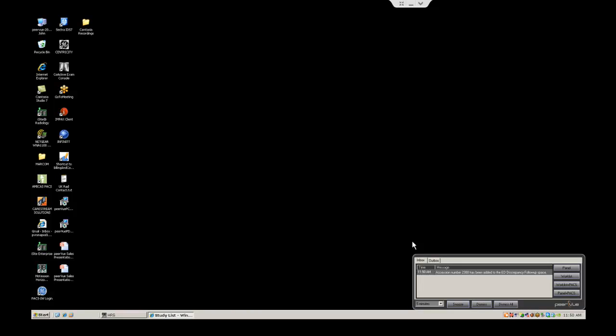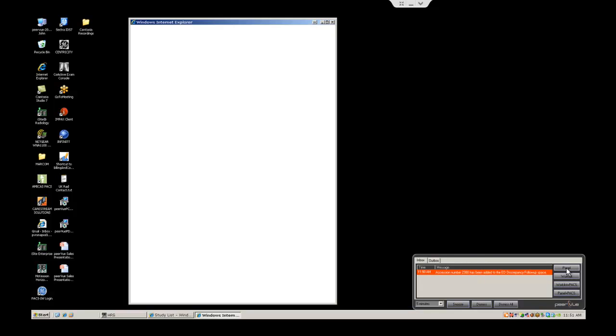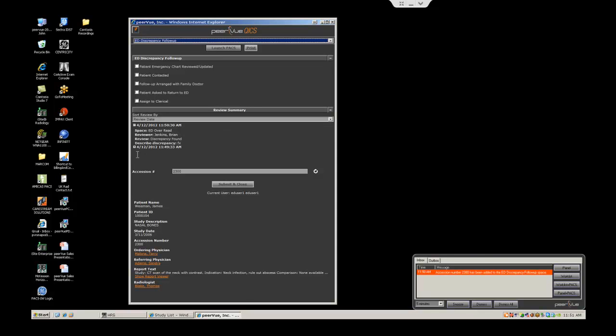We can alert them via work list, SMS, email, or pop-up notification. Typically, this result will go to a more centralized location and not to the original ordering provider who may have provided the prelim, because the chances are that provider is no longer on staff. As you can see, we can alert the users that there has been a discrepancy.